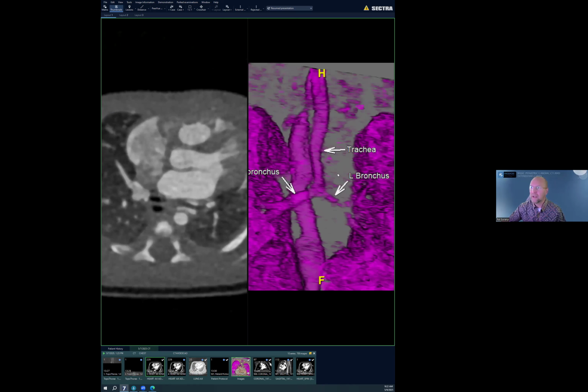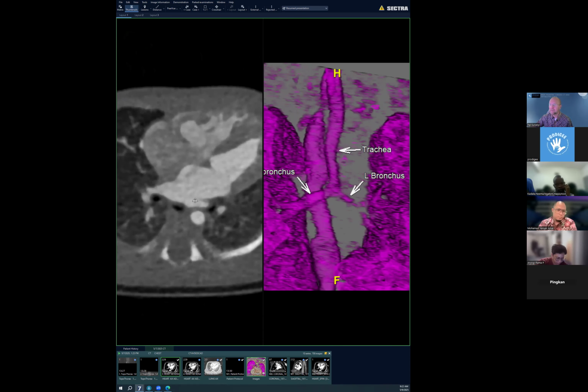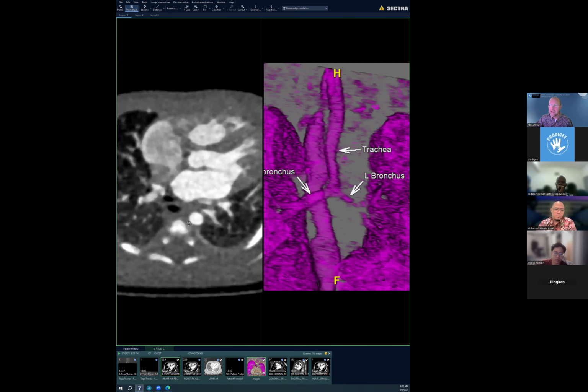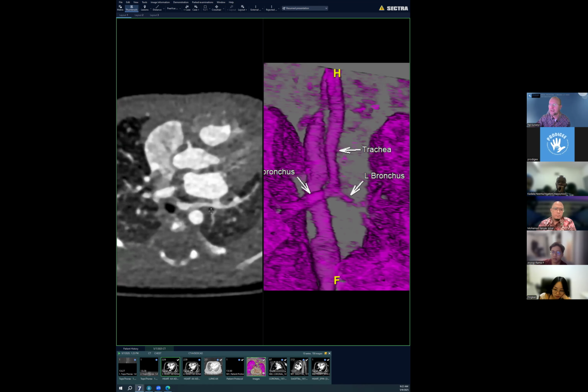So not only do we have an issue with the pulmonary sling in the distal trachea, where actually even morphologically it's questionable if we have rings. I think it's kind of a flattened trachea, so it looks like it's probably a C-shaped cartilage. It's not a round trachea, thankfully, so that gives me a little bit of hope.